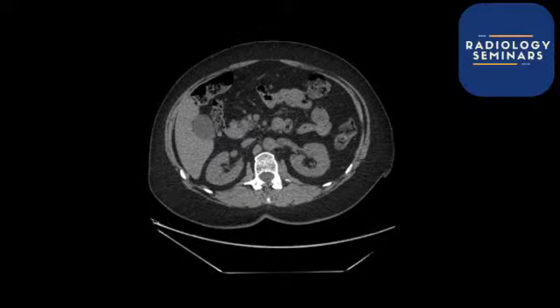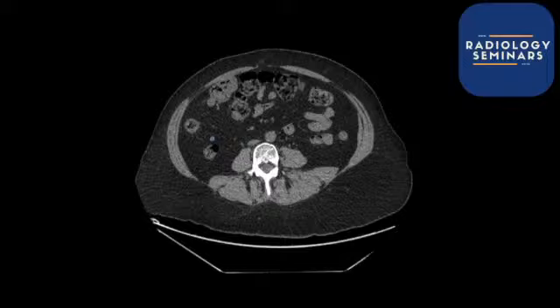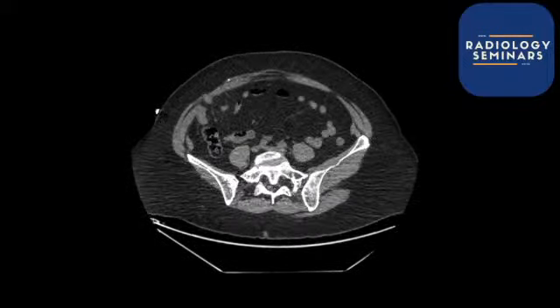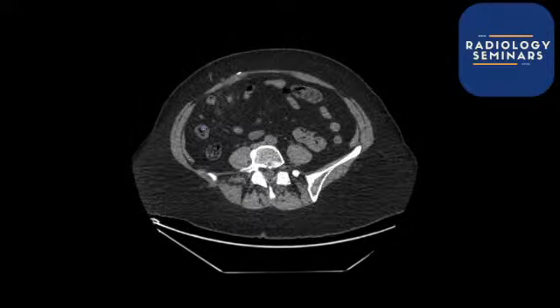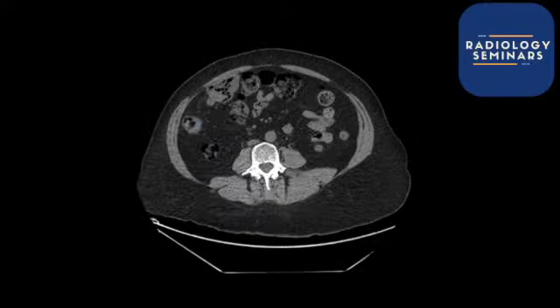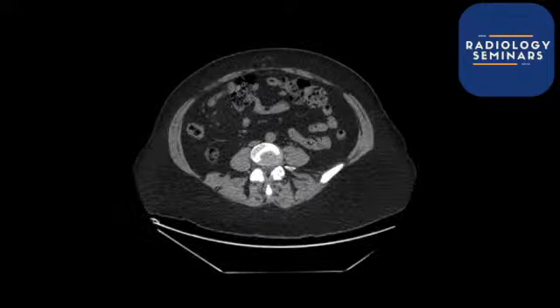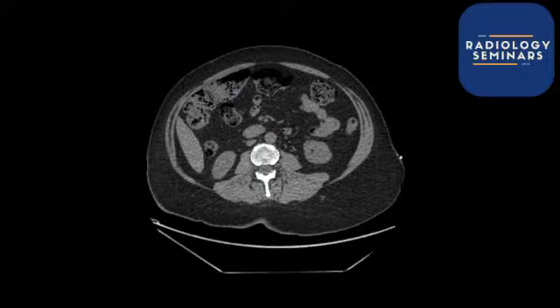And look, now we're at the hepatic flexure, and we're going to work our way down. Maybe some of you've seen it, maybe some of you haven't, but as you come down, we can see that this is more ascending colon, and the ascending colon is now veering up and going down again. It's a bit of a loopy one, this one. And look, now we're coming across this way. It's all a bit confusing, but what's actually happened is that the cecal pole is quite high up within the right upper abdomen.